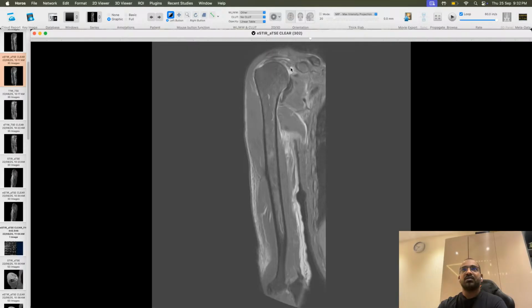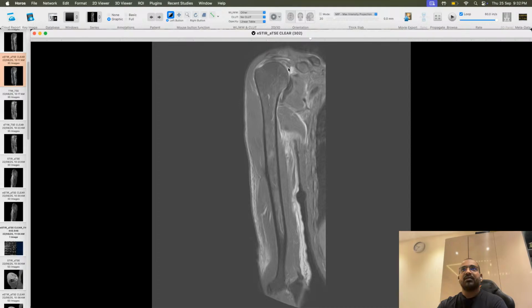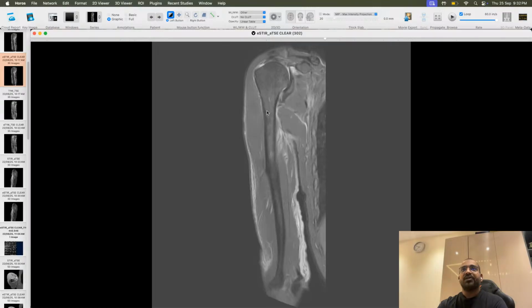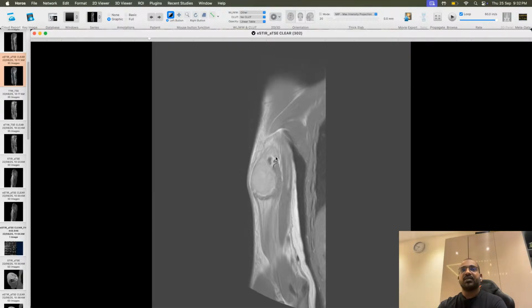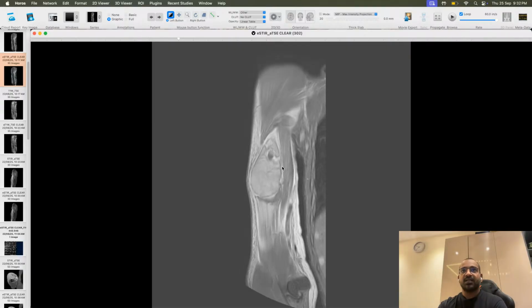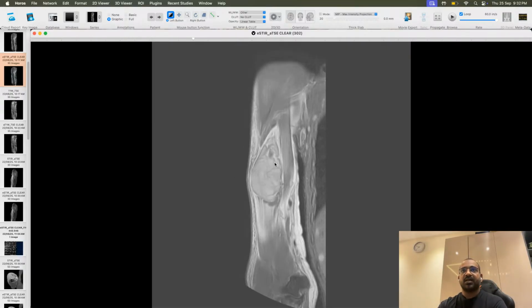If you see, this is the superior glenoid tubercle, and some part of the intra-articular portion of the long head of biceps tendon appears over here. After that, nothing is seen. So we need to mention what we need to mention. There is hematoma sitting within the biceps muscle at the level of mid shaft of humerus, and the tendon is retracted.